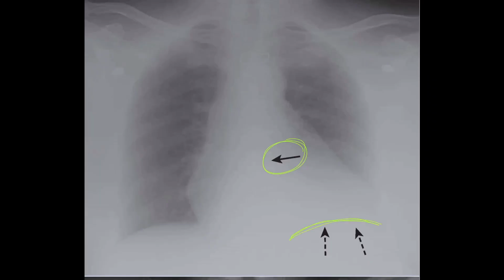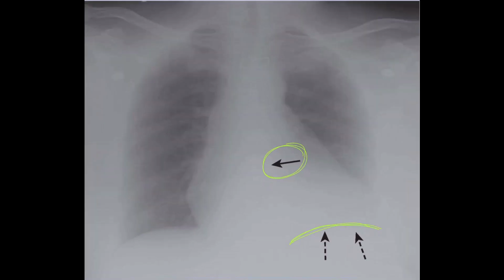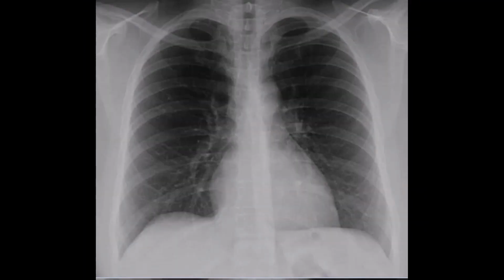And this technical artifact could either mimic or hide true disease in the left lower side of the lung, like pneumonia, atelectasis, or pleural effusion. The other problem is that the bronchovascular markings of the lung tend to be more accentuated, which may give an impression that the patient is congested. So my advice is to be careful with the underpenetrated chest X-ray, not to overcall a patient who is not congested to be congested.